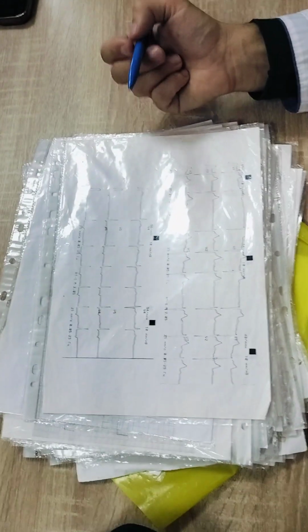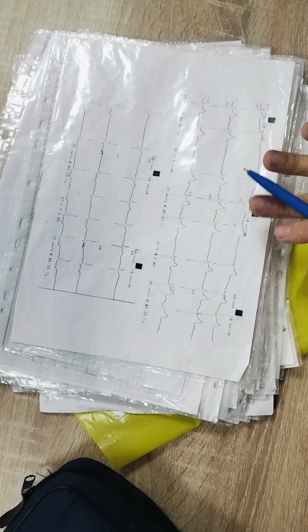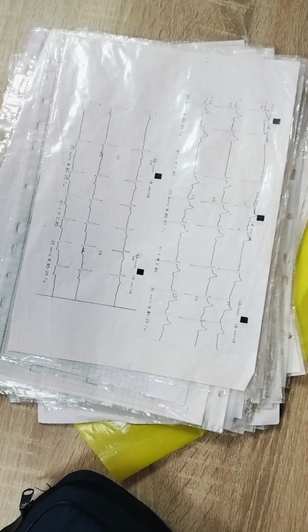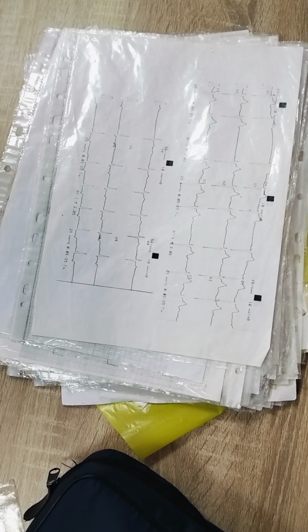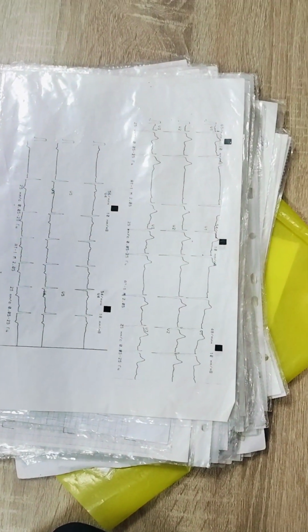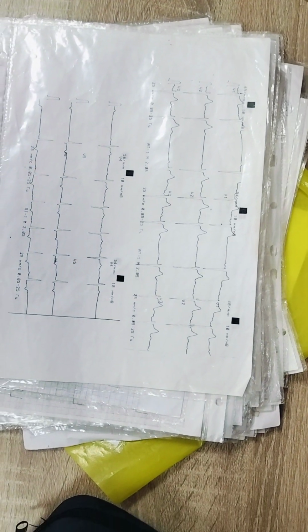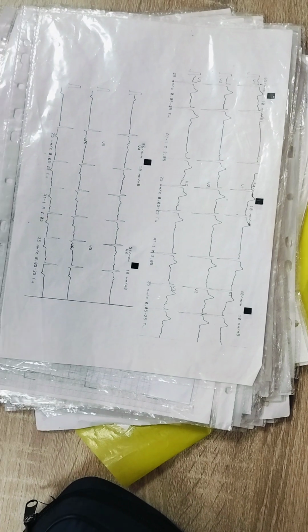Ventricular hypertrophy: how to read? Because of QRS complex is changed. About ischemia, it's better to do troponine test. If troponine test is positive, it's myocardial infarction initial stage. If troponine test is negative, these signs can be due to ischemia, due to hypertrophy of the left ventricle. So these changes are possible in hypertrophy. Remember about it.